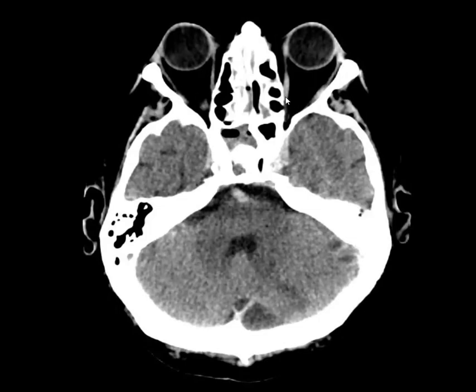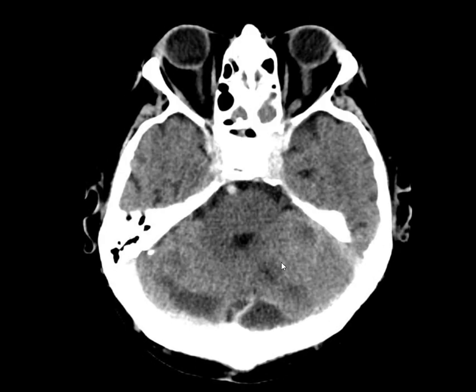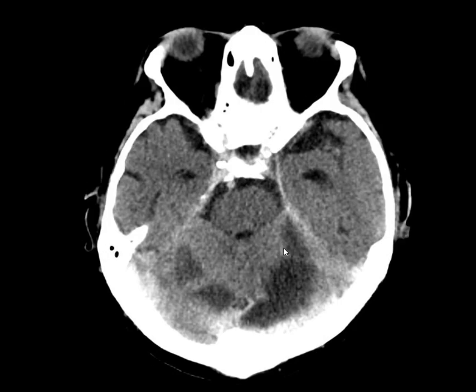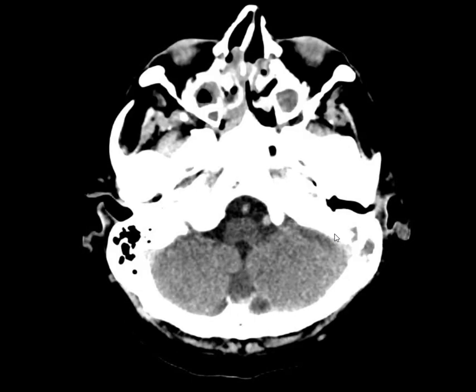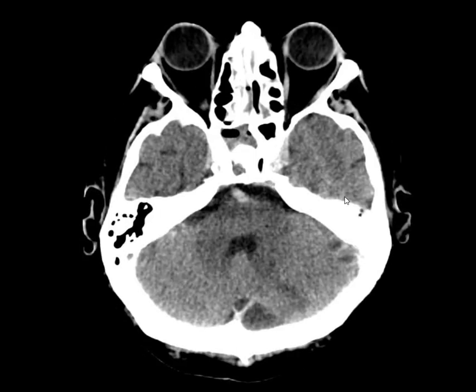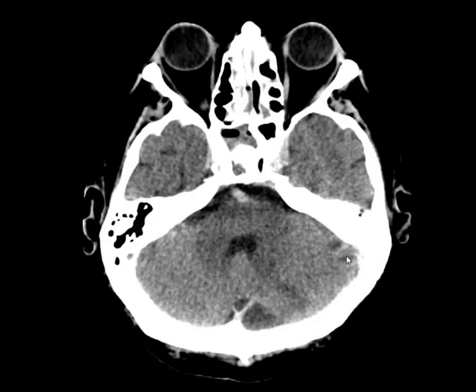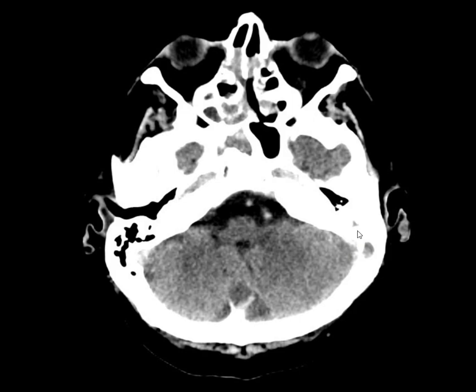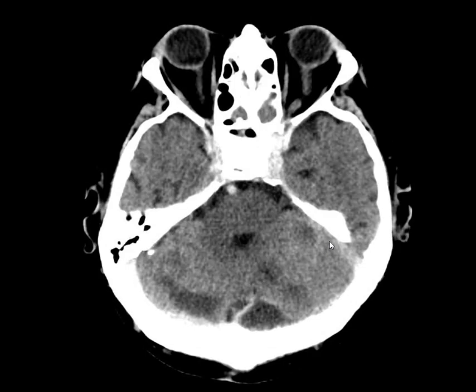contrast did not help us much, but showed the faint enhancement, suggesting it may be some collection, some abscess, and our sinuses look normal. The main worrisome was sinus, because if there is any thrombosis of transverse or sigmoid sinus, we have to find the foci of septic emboli. So it is again a real emergency.